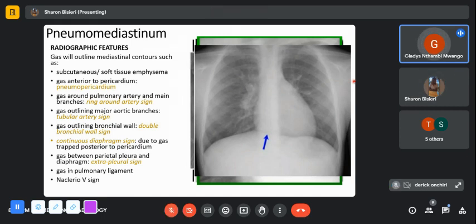Most likely, remember, we tend to do a CT scan in most cases when you're thinking of traumatic injuries, especially chest trauma, apart from when you're thinking of ribs, where you may use a chest X-ray. But when you suspect there could be mediastinal injury, you're going to do a CT chest. From there you can decide the next course of action. You can see from the way the pneumomediastinum looks, and then they can go ahead and do the endoscopy with a view to how they will manage that patient.